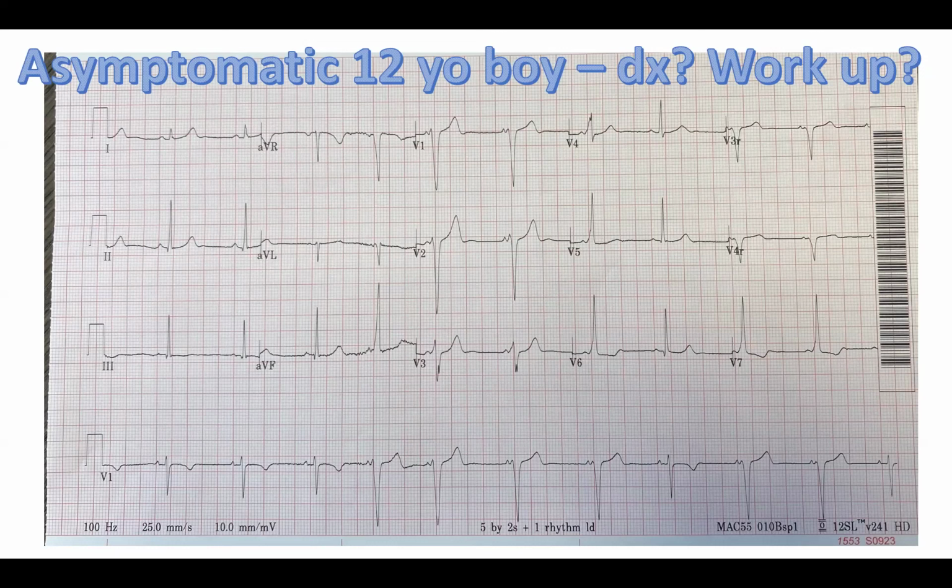I agree with you. This is a patient, and so why do these beats have a normal PR and these don't? What would we maybe call such a patient?